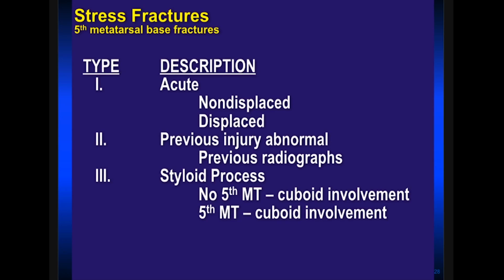Fifth metatarsal base fractures. There are different classifications of these. Acute, displaced or non-displaced. Previous injury abnormality type 2, a styloid process fracture. Fifth metatarsal and cuboid involvement.